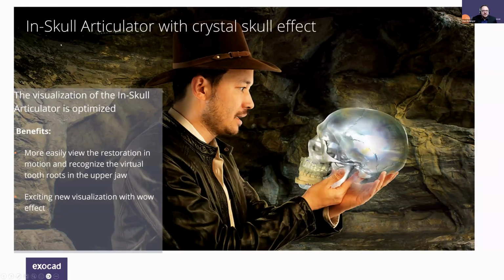And we've been getting a lot of great feedback on this. This kind of ties into us humans versus articulators. From requests from users, they wanted something a little more anatomically correct. And this is what started the articulator option that simulates those lower jaw movements. Due to the positive feedback that we got with that, we've incorporated that lower arch movement for the semi-adjustable articulators as well.